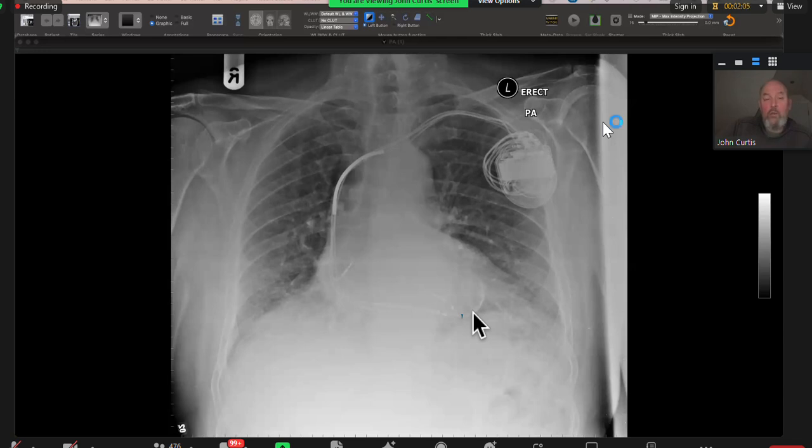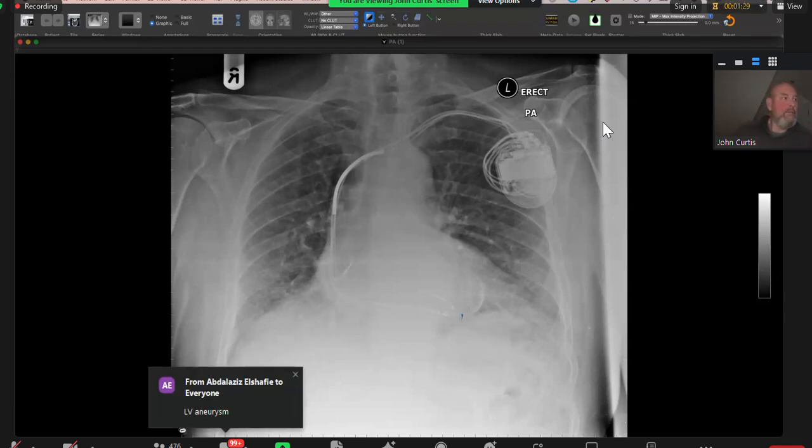So is this patient well nourished? Well nourished, which is a polite way of saying overweight. Yes, I think so, because there's a lot of soft tissue along the ribcage. So if they are overweight, they're entitled to have a pericardial fat pad, aren't they? Yes. So this is the pericardial fat pad, but the heart ends about here. So what's this calcified? So this could be calcification of a ventricular aneurysm. Excellent. That's what it is. Brilliant. Okay.